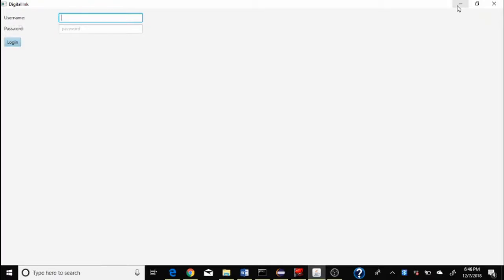For ITM 510, my final project was called the SmartInk segmentation tool, where I take in a data file that was collected with a smart pen, and I show that data on the screen and make the user able to segment that data into different data classes and labels that I have set. This is for use with the MMSE, which is a cognitive examination that we use at the Alzheimer's Disease Center where I work. So first is the login screen.